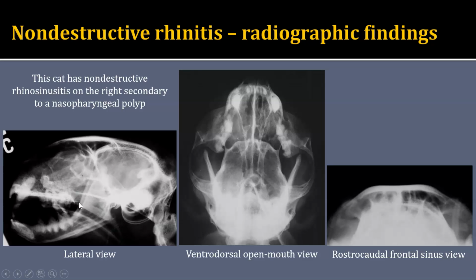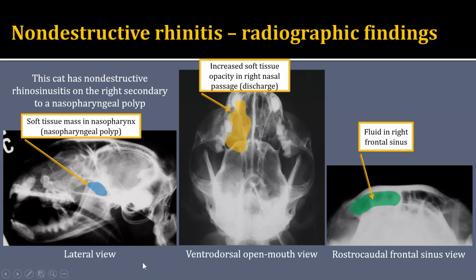But in this patient, I actually can identify this little soft tissue mass, which actually is the patient's nasopharyngeal polyp. I would look at this patient's clinical presentation. If this is a young patient, it's much more likely that this will be a nasopharyngeal polyp than, say, something else like a tumor mass. In this case, it was a nasopharyngeal polyp, and those polyps may oftentimes be more caudally located as well. But again, I draw your attention to always assess that nasopharynx. In the presentations, we will oftentimes have a follow-up slide with labeling, and that really is for your review.